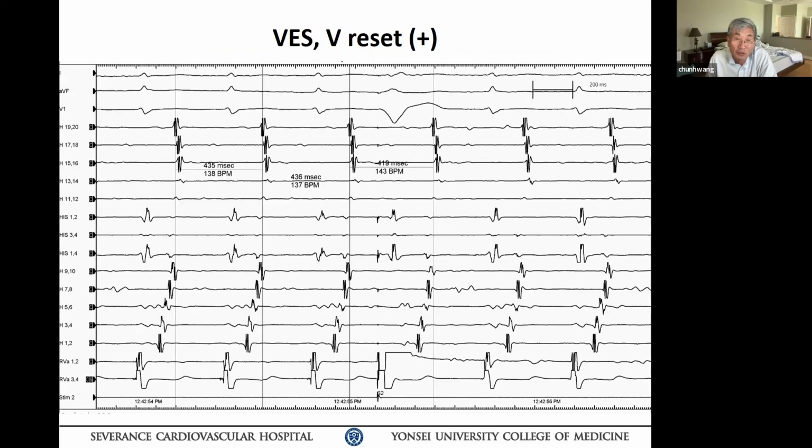So here, what did you do? With the V extra stimulus, you advance the A. Okay? If you measure the HH interval here, I think it's the same. By my eyeballing, if you measure the coupler to H interval, the 2 preceding complexes, and then measure the H between that and the PVC following that, I think it looks the same size to me.